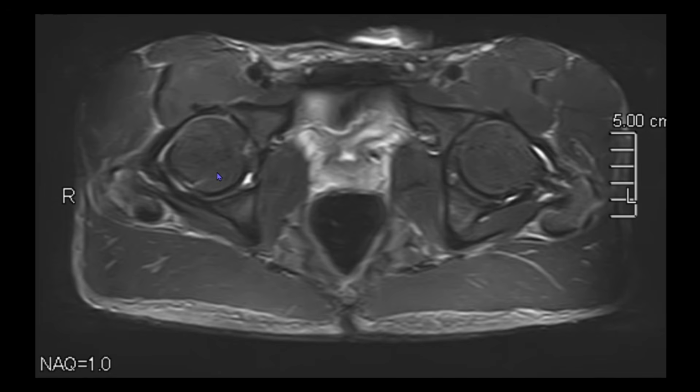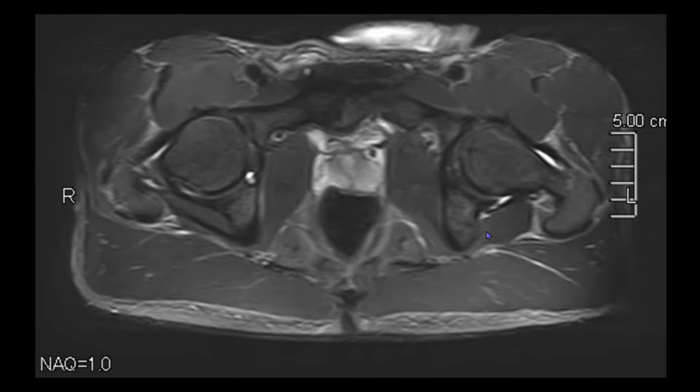So in a patient, we need to be careful and not be satisfied with a single finding. There can be multiple findings which are helpful for us to know and to see the scan thoroughly.